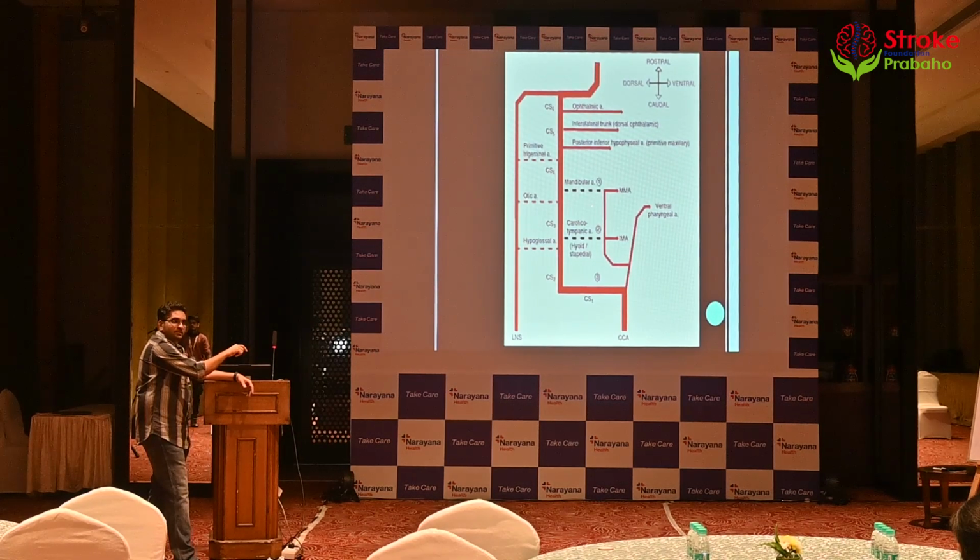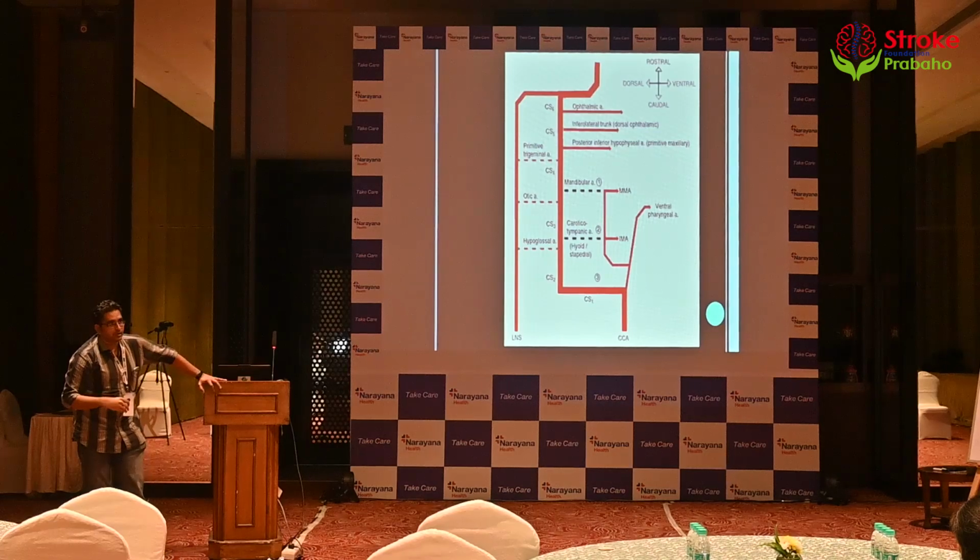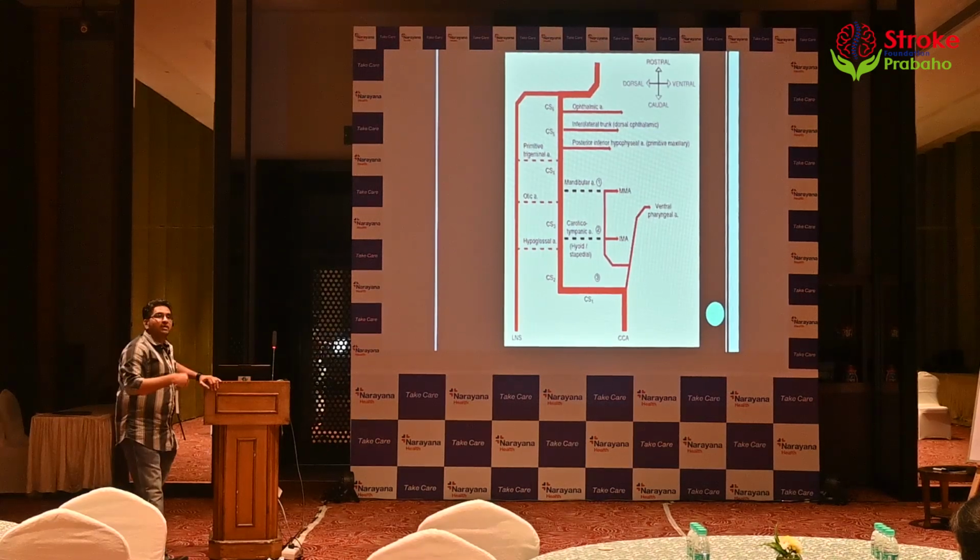This is your artery of the Vidian canal. It supplies to the IMA or the pterygovaginal branch. If this goes, MHT takes over. If this goes, ILT takes over. If this goes, ophthalmic takes over. It's beautiful if you actually start understanding how they work this out. Practically, is the names or the semantics that important? I don't think so. But it helps to understand why the reformation happens.